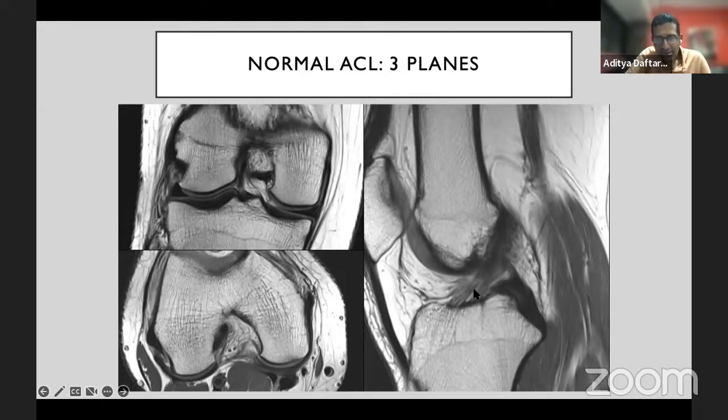All right, so you can see these striations in the tissue, and this is what many people tend to call ACL sprain, or people tend to call these things mucoid changes. But this is a normal appearance that we see, and we'll talk a little bit more about this.